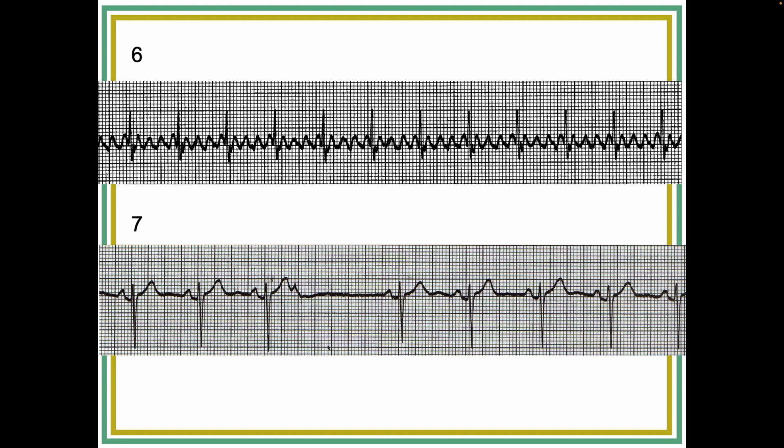Okay, so we've got an early something or another. So it's premature. So Brandon? Is it a non-conducted PAC? Yeah. So remember, what happens is there's an ectopic focus that fires off within the atrium, and that's what this P wave is. It's an atrial P wave. It's upright and comes in early.